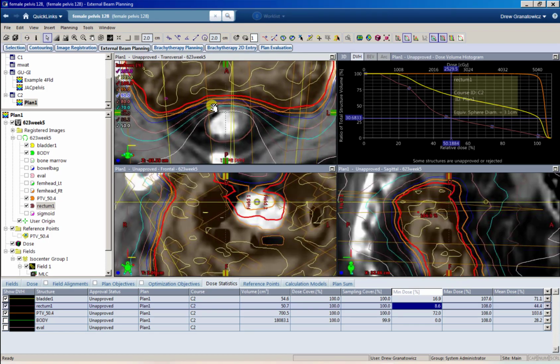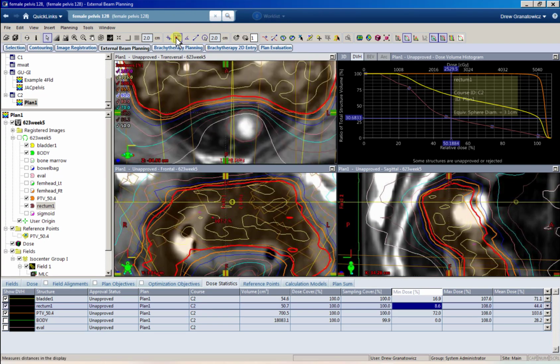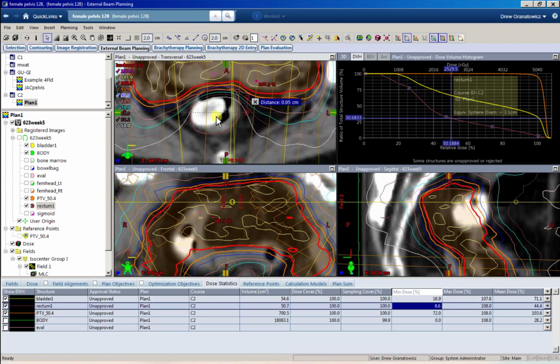But again, I just came to those conclusions by looking at our actual dose distribution. If we measure now, so from 100 to 50, we're still about the same thing. So we're probably not able to do much better than that 5%, like I was saying, on such a large volume, but it was still able to carve out some of that dose, probably a little bit throughout the whole thing, right? And it just added up to that 7-8% that we needed.